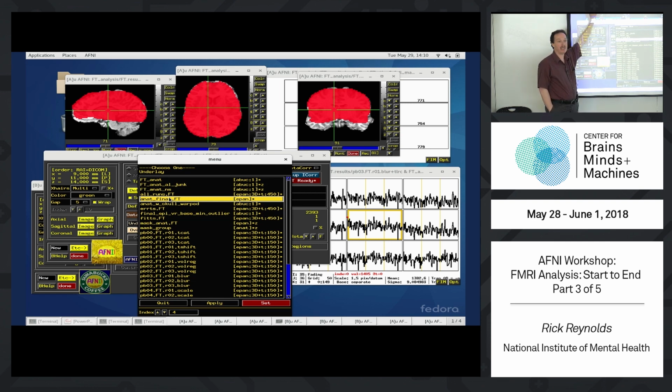So this mask doesn't get applied. Also, remember, for quality control reasons, we might rather not mask the data at all in the regression. So, if we see blobs outside the brain or motion, if we see results all over the edge of the brain, we want to see this. We don't want to just close our eyes and mask it and just assume everything's hunky-dory, right?